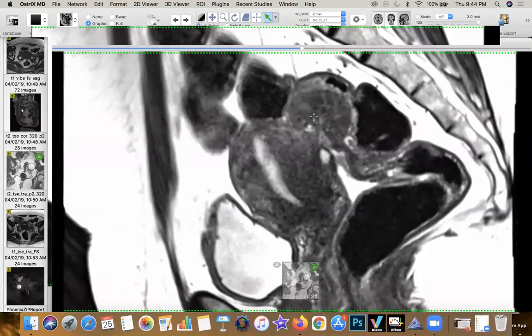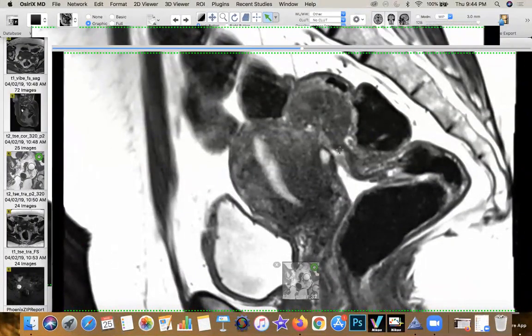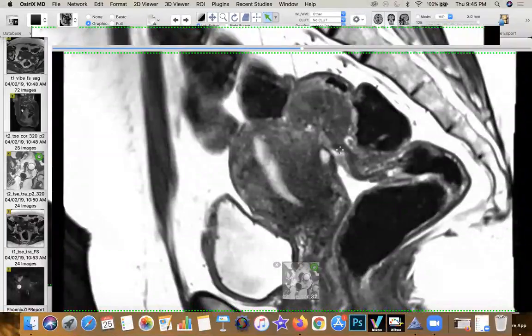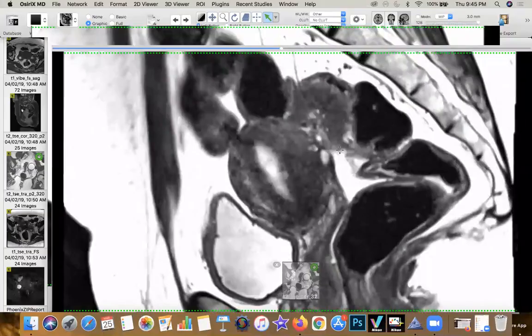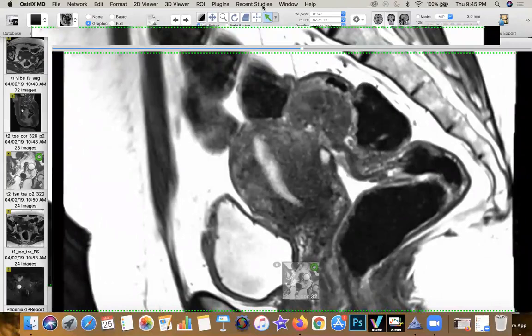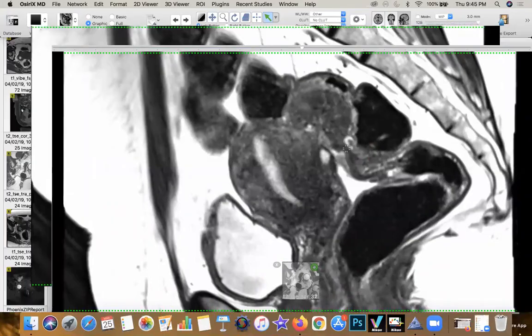The third terminology you should always remember whenever you're looking at rectal or bowel endometriosis is multifocality versus multicentricity. Now, multifocality is the same segment of bowel showing 2 or more sites of involvement. Multicentricity is multiple bowel segments showing involvement by endometriosis. Now, in this case, what we had was full thickness infiltration, and you had a little more thickening of the upper and mid rectum seen out here, which is abnormal, which is again a multifocal site of disease involving the rectum itself.